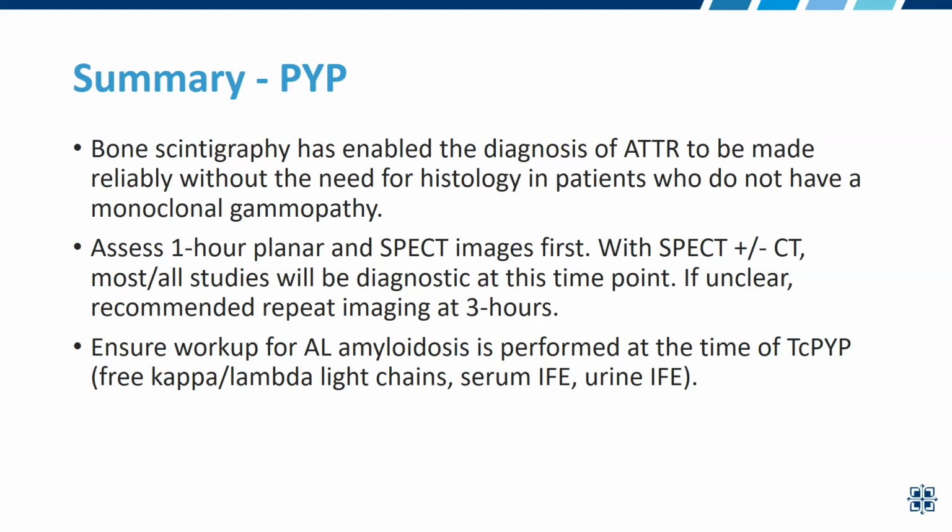SPECT. If you have SPECT CT, that's great. If not, at least acquire the SPECT images and review them. Look on dedicated cardiac software through the SPECT, scroll through the heart. Really make sure that what you're seeing is myocardial uptake or not myocardial uptake, and just blood pool or some other bright anatomy there, because the consequences of a false positive or false negative study can be terrible, really.